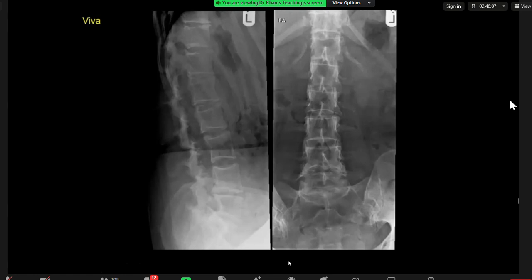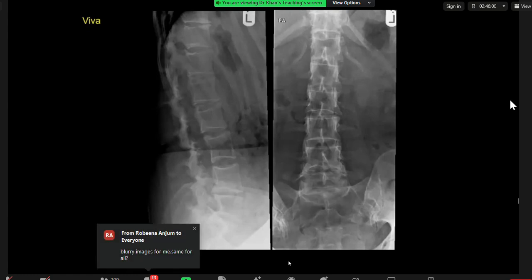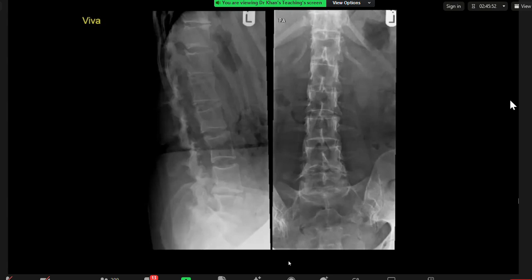The two combined together makes me think of an intraspinal mass, which has been long-standing for a long time. The differentials for this could include things like myxopapillary ependymoma. You can also get this in things like neurofibromatosis and NF1. I would recommend a spine MR for further characterization.